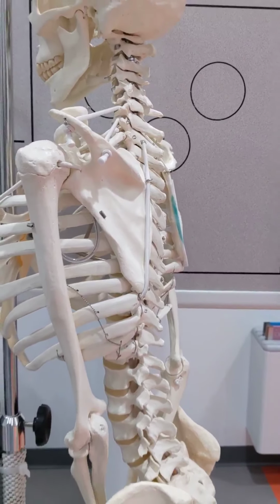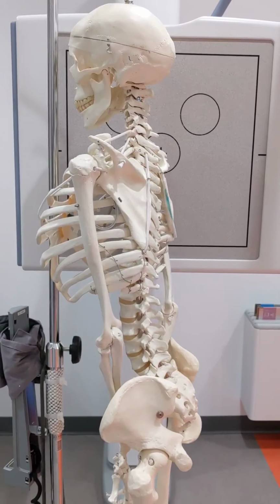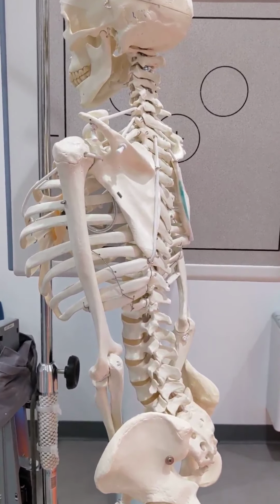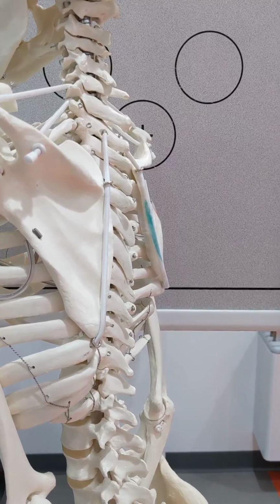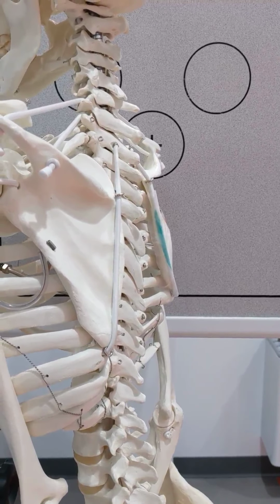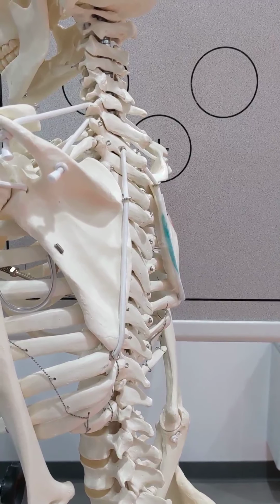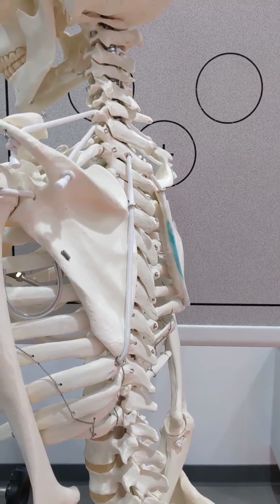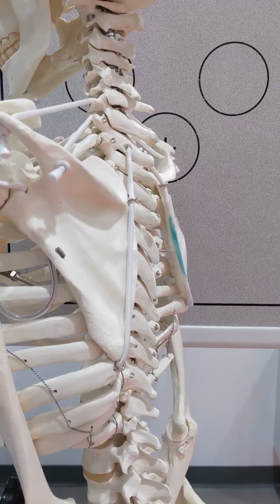So now that we've reviewed the positioning and the anatomy of the Y-view shoulder, let's go on to the critique of it. So as I said, what we want when we position this patient is to have a lateral view of the shoulder, which is essentially where the scapula is in a lateral projection. And that's when the medial and lateral borders are superimposed.